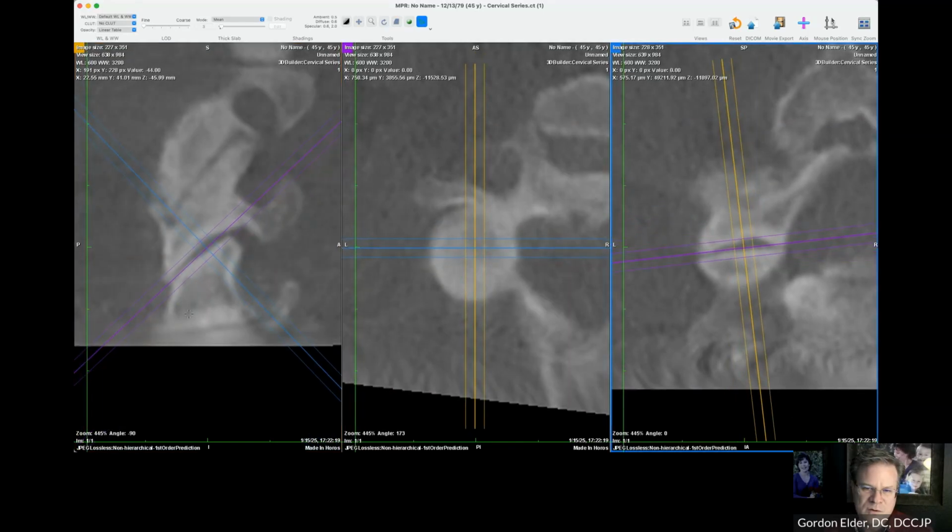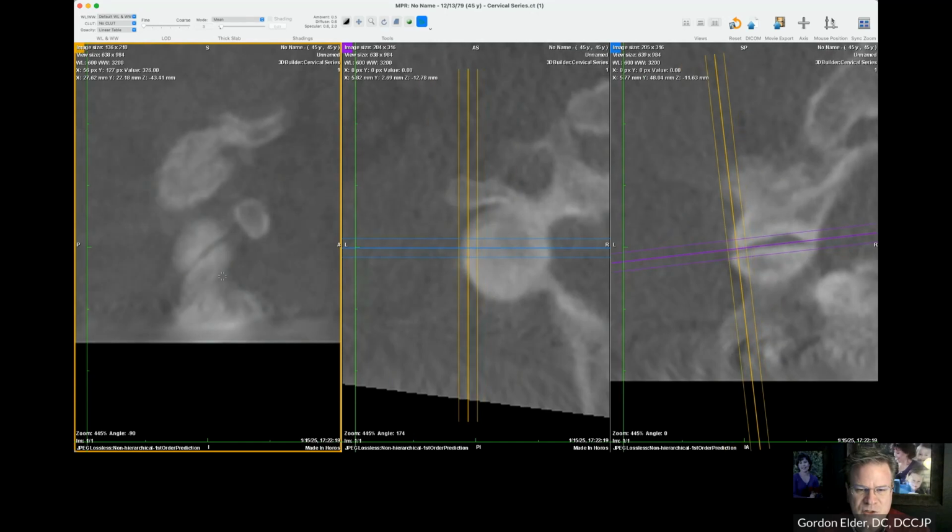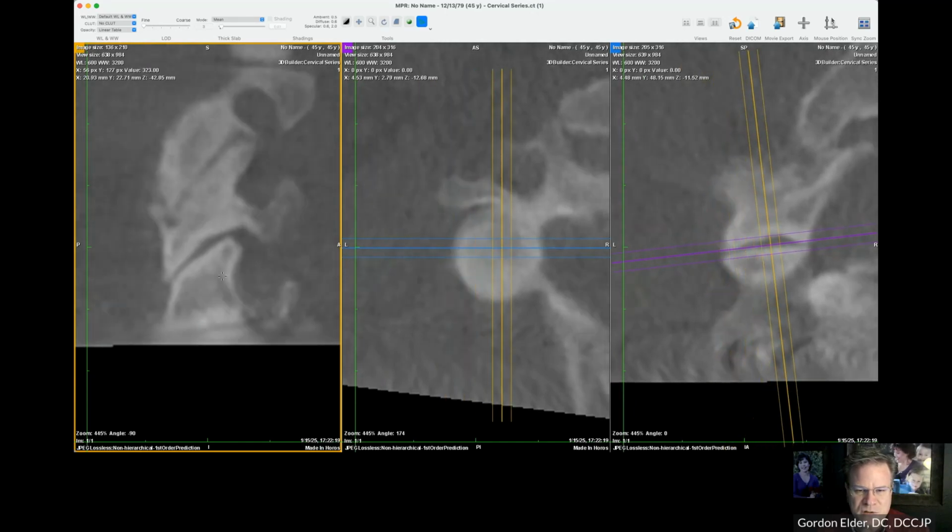Really hard to see. Down here, if we look at C3 on 4, line it all up. This one's going to be a little bit easier. Now the back looks bigger. It looks like it's gone posterior, but that part often does. So again, like the atlas, there are certain parts of the joints that should line up if everything's okay, and certain parts that just naturally don't.